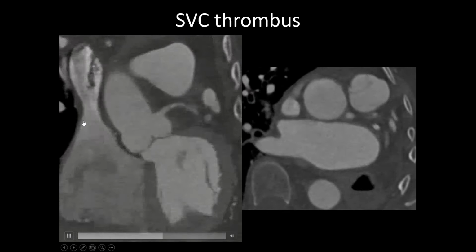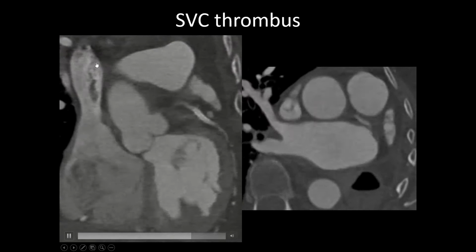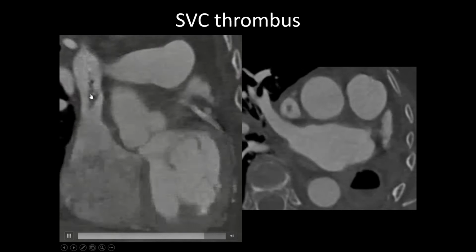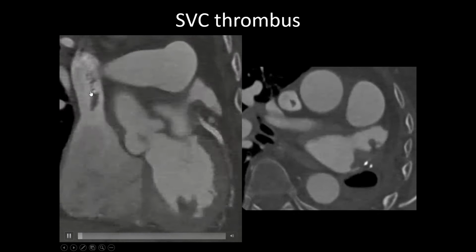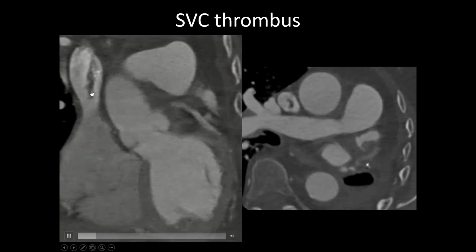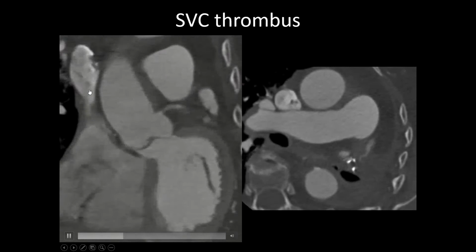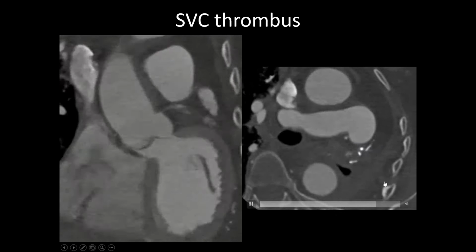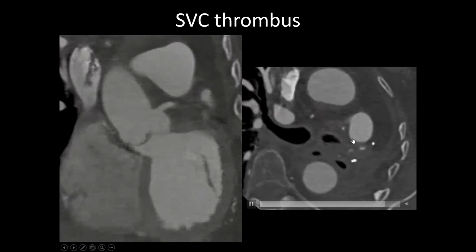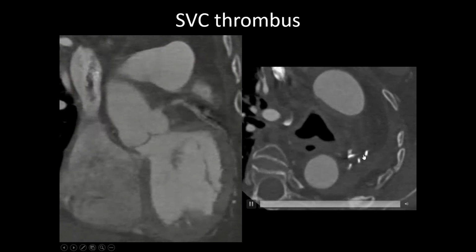And so the concern is, we looked at our old CT and it looked like it was extending a little bit further than it was previously. So our concern was, is this impending something significant? Remember, this lady has only one lung, and so she only has one pulmonary artery. This is the residual, the left pulmonary artery that has been essentially excised.